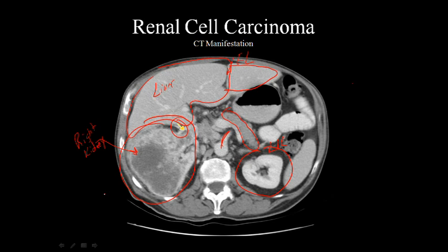I'm sure just by simply looking at this, you can see that the structure is very abnormal. What we have here is diffuse wall thickening of this structure, meaning that we don't actually have a clear border. And we see all of this weird structure laying out here. So we do see that we have some degree of septation there, and there is slight degree of enhancement here and here, but most enhancement there.